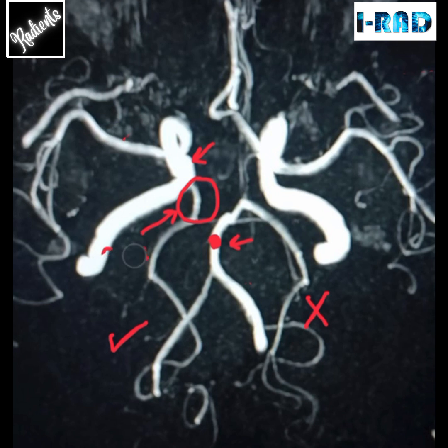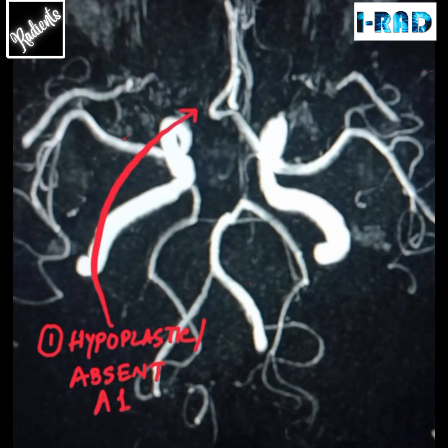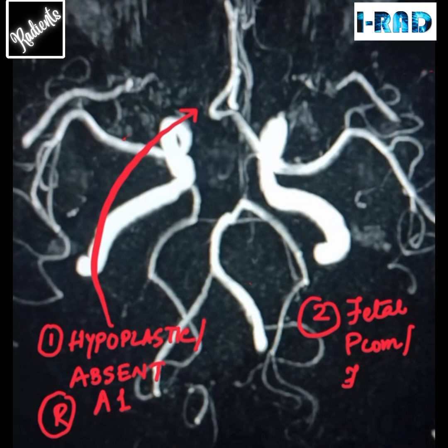So basically what we see in this case are two variant anatomies: number one, a hypoplastic or absent A1 here on the right side, and number two, a fetal PCOM or fetal PCA, that is here. So these are the two anomalies that we are seeing.